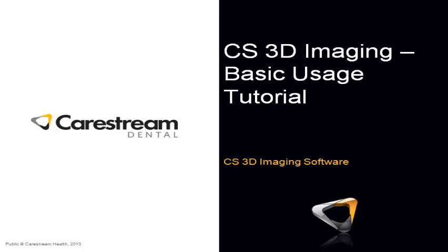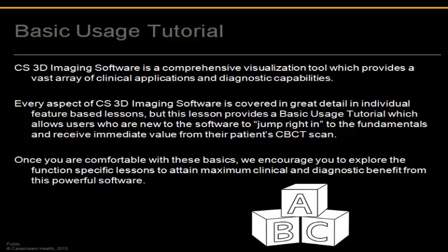This lesson will provide a basic usage tutorial for CS3D imaging software. There are very detailed feature-specific lessons available for every aspect of CS3D imaging, but this lesson will allow new users to jump right in and become familiar with the software basics.